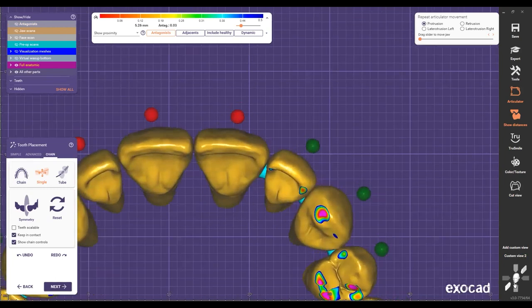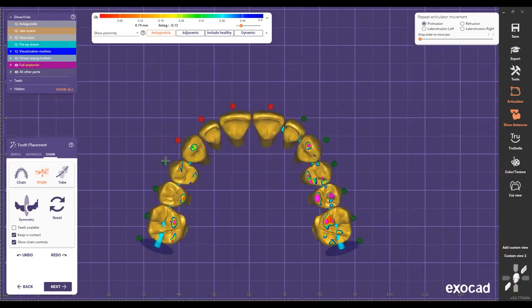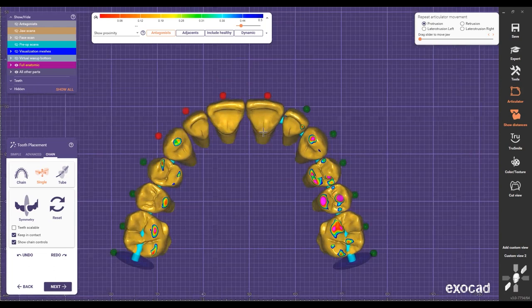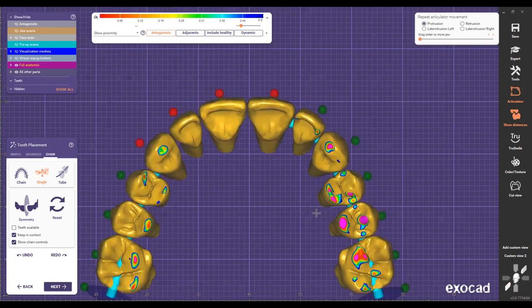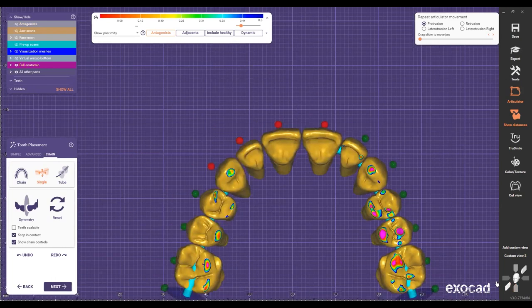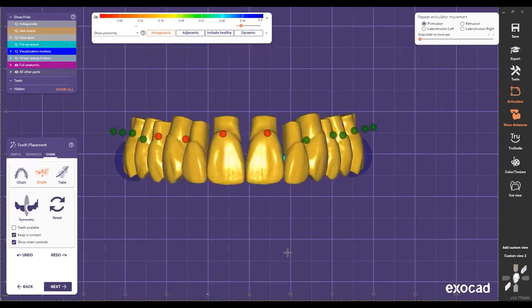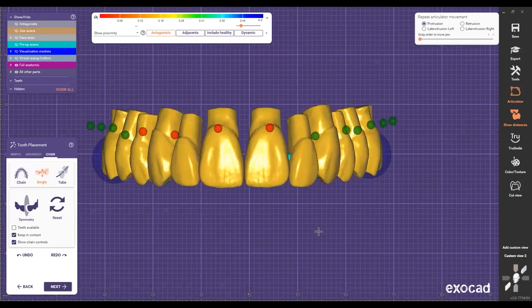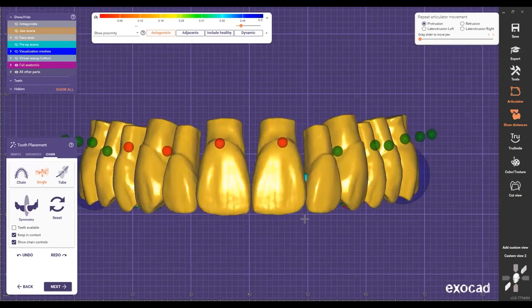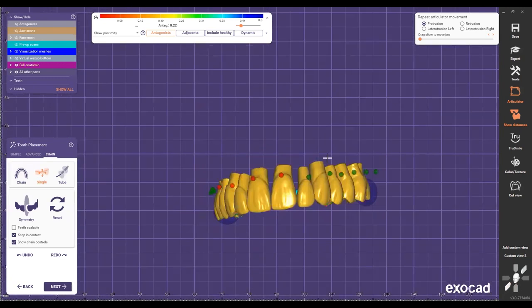And I wanna make sure that I follow a nice curvature here of the buccal incisors and buccal cusps. They're lining up, and then also the fossas and the lingual cusps, and then the incisors right here. So now I can see that this looks good there, and in the different views. So the way aesthetically it's gonna look nice in the face. So I go closer. Now I just start moving this a little higher right there. And I'm looking for these V's right here to make sure that it's gonna look beautiful in the face as well. So now I can just go jump to lock this tooth.